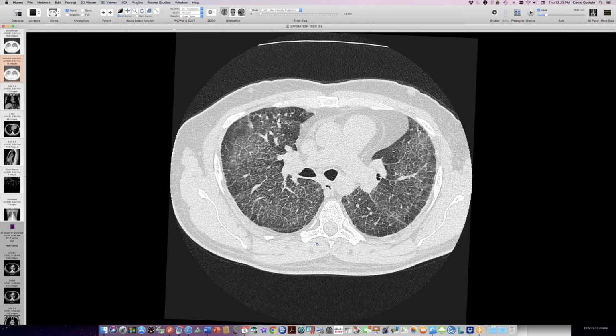I was going to say, drugs like Humira can cause sarcoid-like reactions. And so I agree, those lymph nodes look kind of sarcoidish. They were plump, potato-looking nodes. But you don't really see a very lymphatic distribution in the lungs. If it was all lymphedema, and the lymphadenopathy is gone, you'd expect the lungs to get a lot better, because that lymph should clear out pretty quickly. Think about how quickly people clear their lungs with heart failure with a little fine tuning.